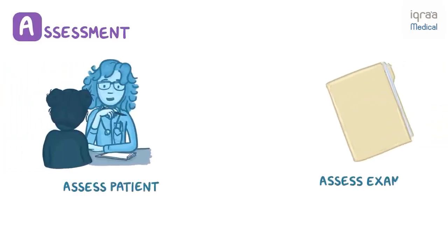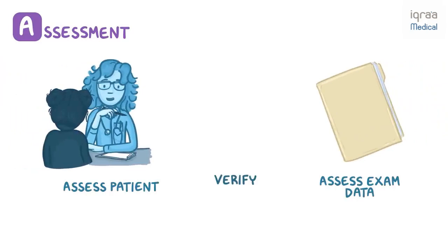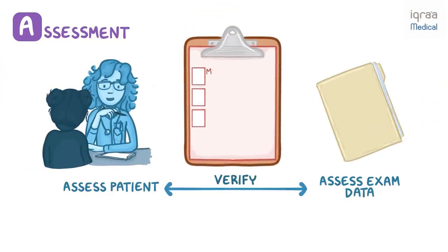A stands for assessment. To avoid errors and wasted time, you should always begin by assessing the patient and exam data. You want to verify the patient's data with the exam data, or the medical record number, date of the exam, etc., to ensure that you are looking at the right study and patient.